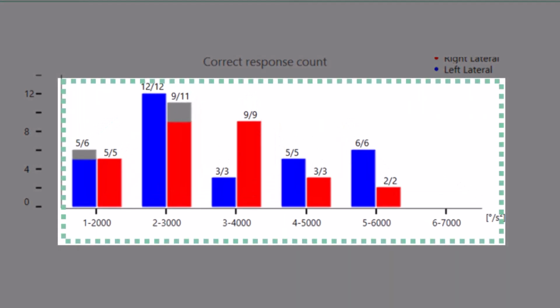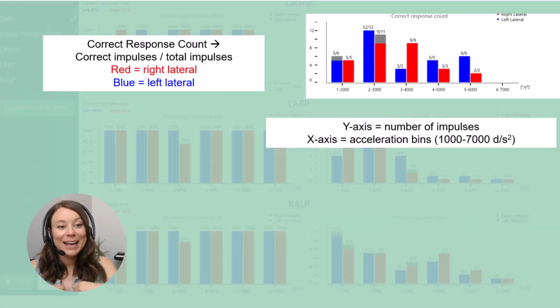Now, part of this, as you're getting comfortable doing this test, you'll notice that technically, as a clinician, sometimes it's hard to vary our speed, especially if you're used to performing the video head impulse test, where you're really looking for the same velocity of head movement, each head impulse to the right or to the left. It could be a challenge to start varying your head speed for that patient.